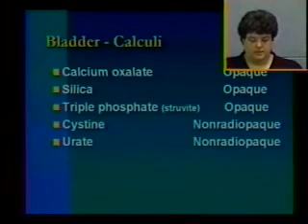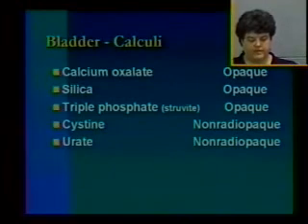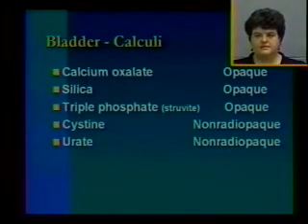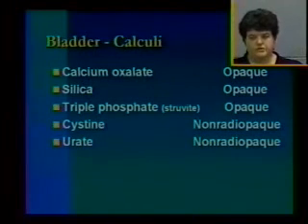Bladder calculi, getting to the end of this. I'm only going to touch upon them on the bladder because most of the bladder abnormalities need to be diagnosed with double contrast studies or with ultrasound. But you do need to remember which stones you can see on plain films and which stones you can't.